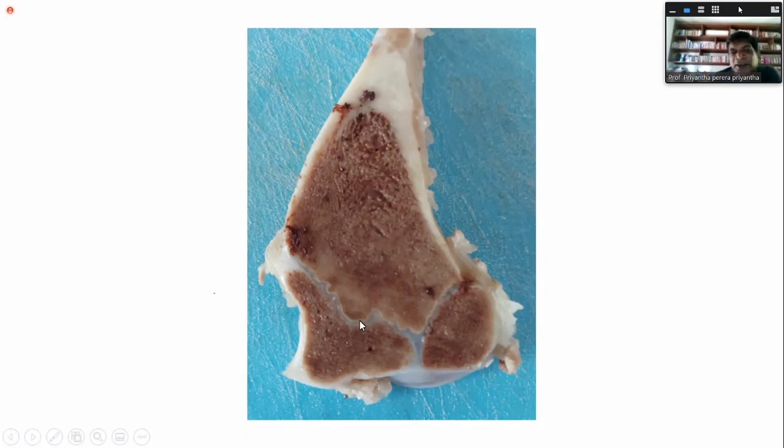Now in rickets, what happens? You might not see the secondary epiphyseal center that much, and the growth plate will produce osteoid, but it will not be mineralized, right? Because there's no calcium phosphate to mineralize the osteoid. It will remain there, and it will form a bulge, right? Because the osteoclast is the one that goes and remodels the bone, the shape, all the processes. It will remodel the bone formed by the osteoblast, right? But the osteoclast can't do anything with the osteoid material. So there will be a bulge of osteoid at the end of the bones.